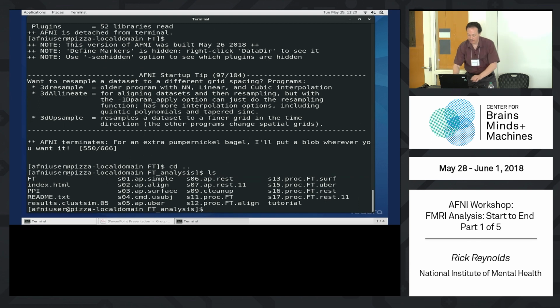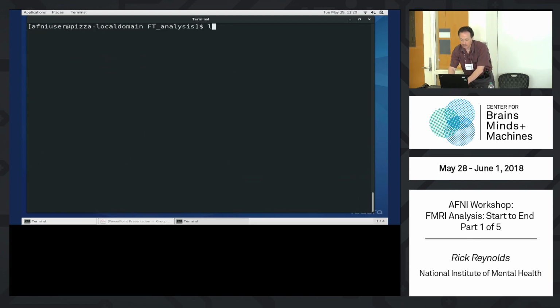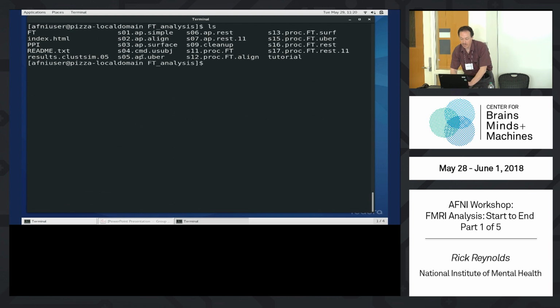So before it's lunchtime, let's get this thing fired up. So remember that proc script is s05. This generates and executes the proc script, so we can just run this and then run out of here for lunch. So tcsh will just run that command that we looked at earlier. Again, this is afni_proc. afni_proc is going to write a proc script and then start executing it. And we can babble about that when we get back.